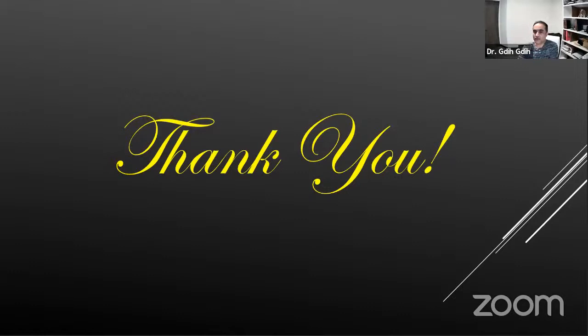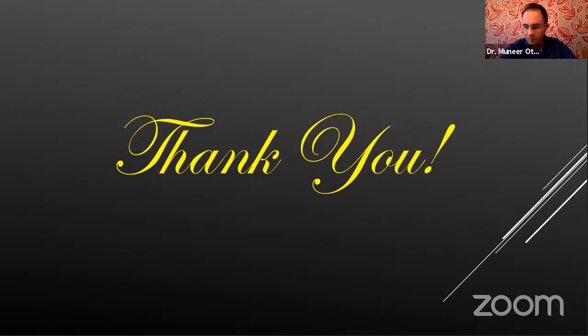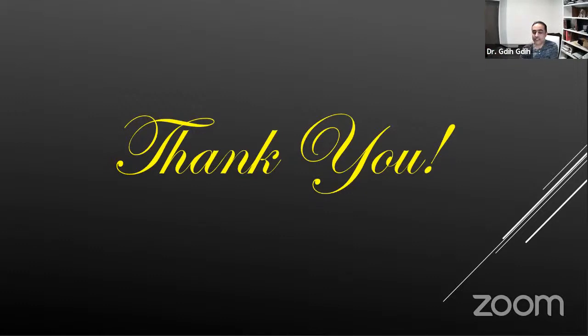Progression analysis is more of a... that needs another 2 hours like this. Oh, thank you. But for this one in particular, I wanted to help people, when they hold the visual field, to make sense of it and know what to look at when they're going to read it quickly.